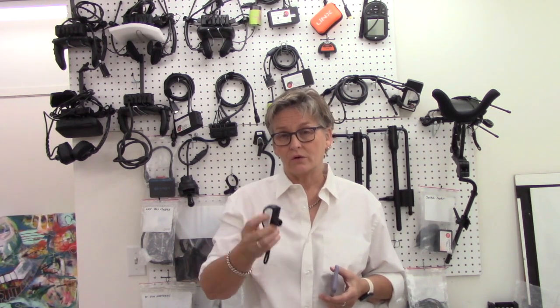Let's look at the programming, and we're going to look into the profiles and functions that come standard and pre-programmed within LiNX electronics. So what I'm going to have you do is plug your LAC into the front charging port on either the front of the joystick or the display. So where you normally charge it, you're going to plug a LAC into it, which is a LiNX access key. And you're going to open your app on your phone called LiNX Access.